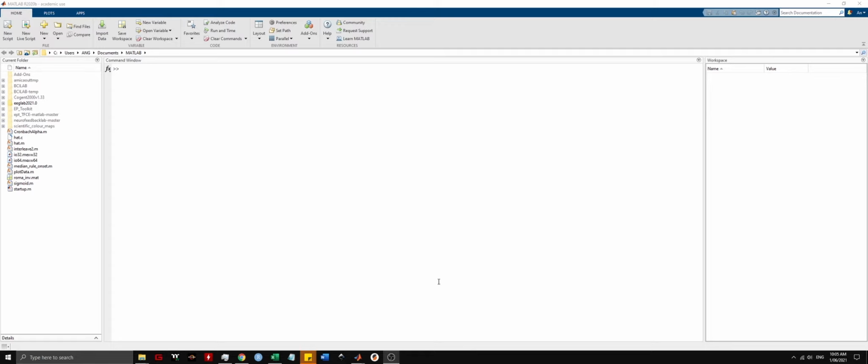So in this video, I'll be talking about how to load your data. I'll be talking about referencing, filtering, dealing with bad channels, and artifacts like eye blinks, and how to extract epoch segments. And then I'll finish by showing you some plots of the data that we processed.